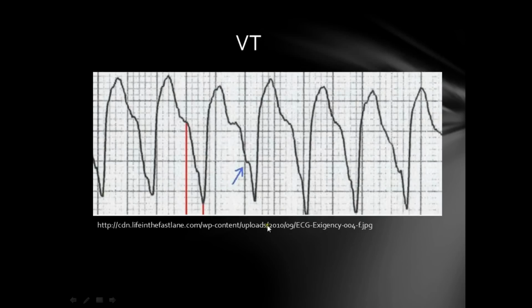And you can see on this example here, from the onset of the QRS complex right here to the nadir, or the lowest point of the S wave here, is about 3 small squares, which is more than 2.5 small squares. Therefore, this is Brugada's sign.